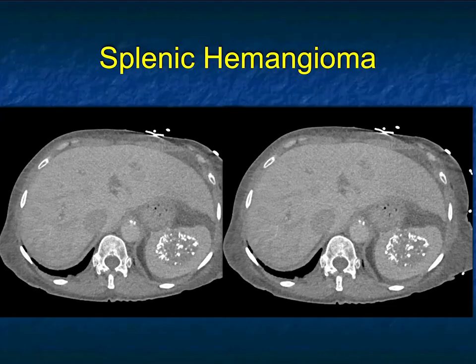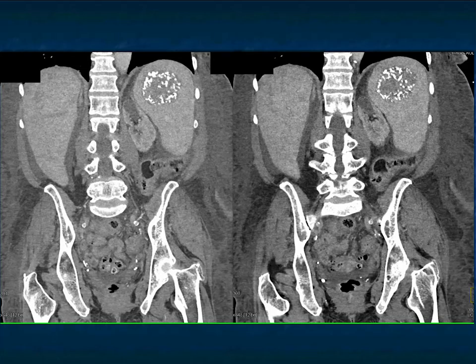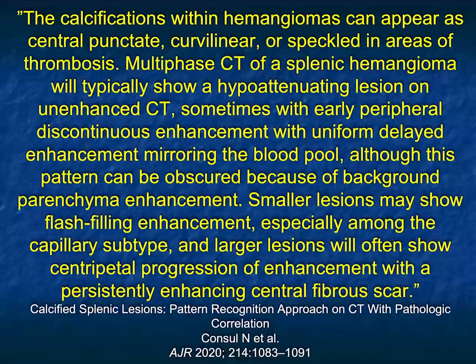Here's an example with splenic hemangioma with calcification. Splenic hemangiomas rarely can calcify. If you look at this lesion, you could think of an old splenic hematoma. I could think about metastasis, but there were no other findings or no other history. But again, occasionally hemangiomas can calcify. Some of the other unusual splenic lesions beyond hematomas can calcify as well, including occasionally metastasis.